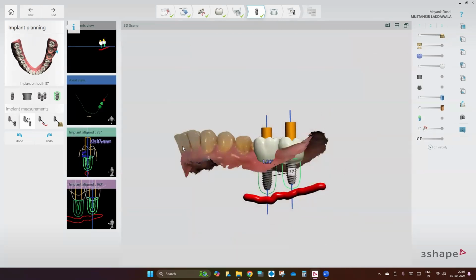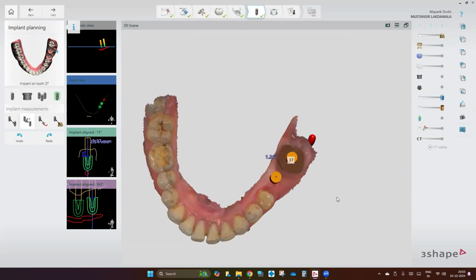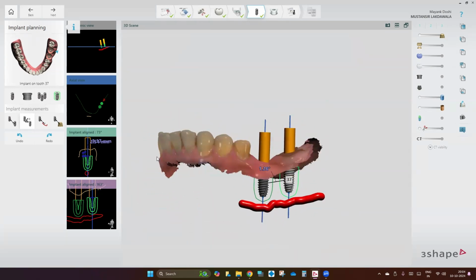क्योंकि as planners future में, you know, when you start planning for people, these are the डिफेंडिंग पॉइंट्स. You all will have to know के सर और मैम हमने यहाँ पे क्यों इम्प्लांट डाला है. हमने यहाँ पे इसलिए इम्प्लांट डाला है क्योंकि वो इम्प्लांट वो नेचुरल दांत का सेंटर है. Can you appreciate that it's the center of the socket? Yes, sir. Everyone agrees to that part? And when I say it is almost perpendicular to the occlusal plane, if I draw a virtual occlusal plane.